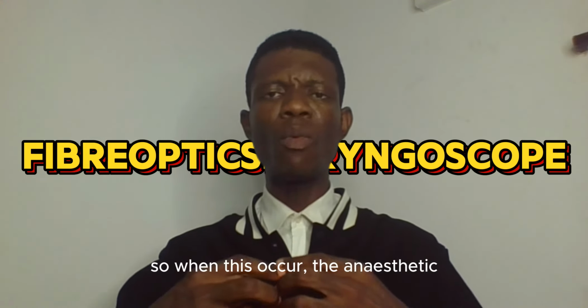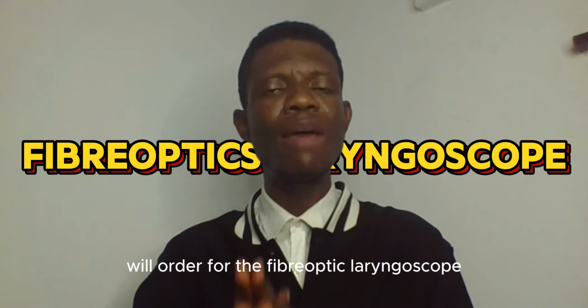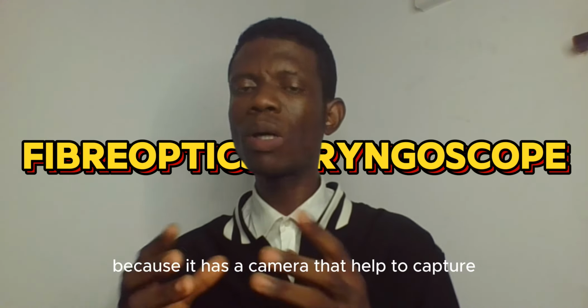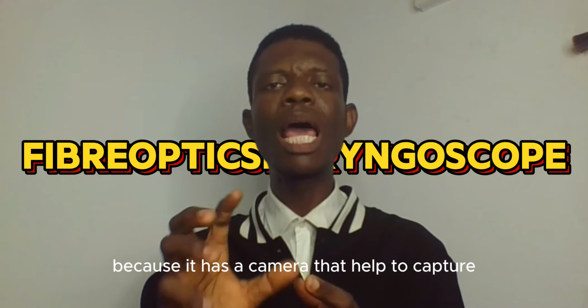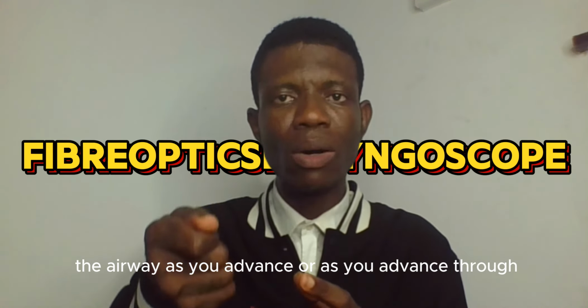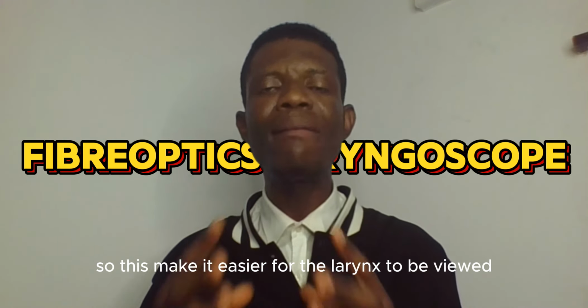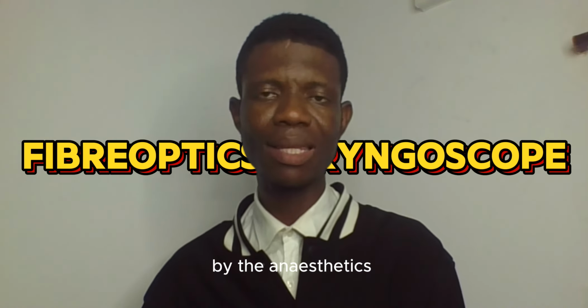When this occurs, the anesthetist will order for the fiber optic laryngoscope, because it has a camera that helps to capture the airway as you advance through. So this makes it easier for the larynx to be viewed by the anesthetist.